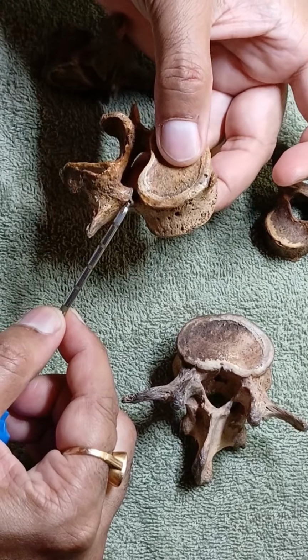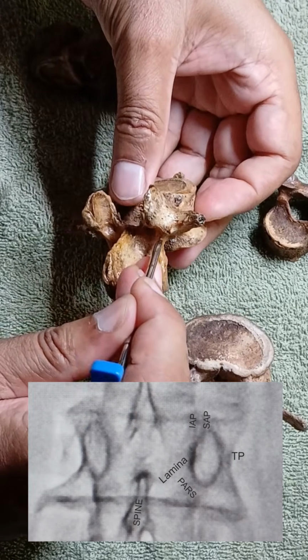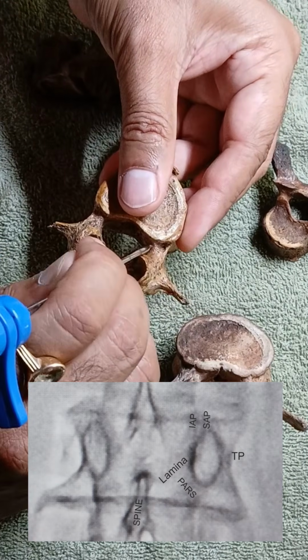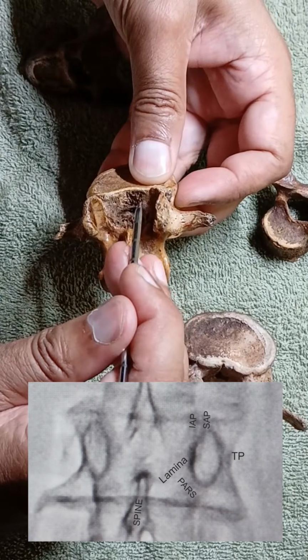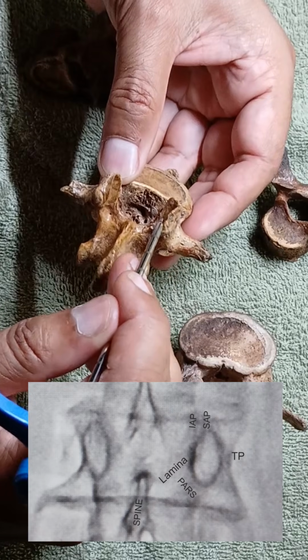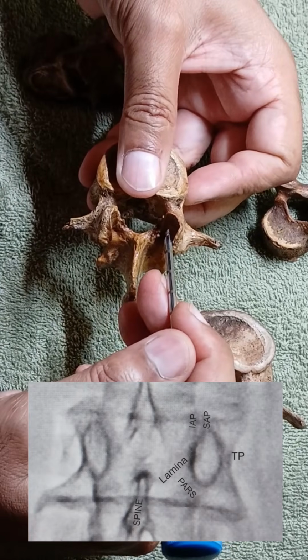When we see the pedicle in AP view or oblique view, we see a silhouette of the pedicle. It has an outer cortex, and inside the bone is the medulla. So this outer cortex makes one shadow here. And you can see how irregular this area is. This is the superior articular process. The articular surface is facing a little posteromedially.